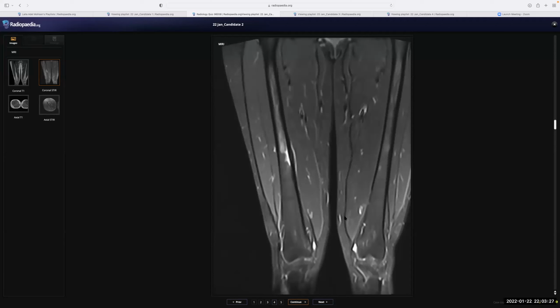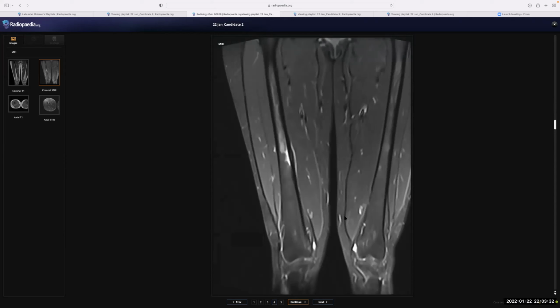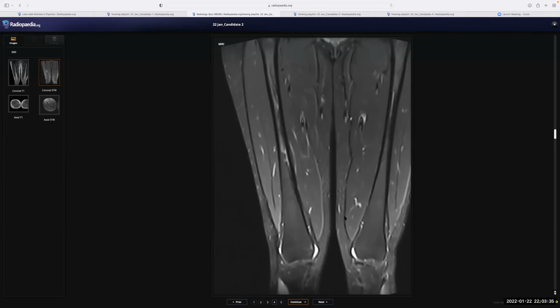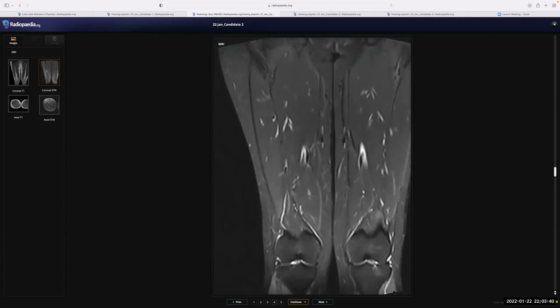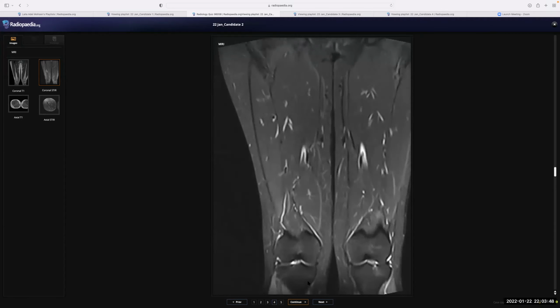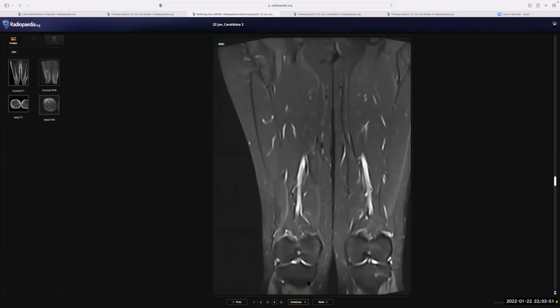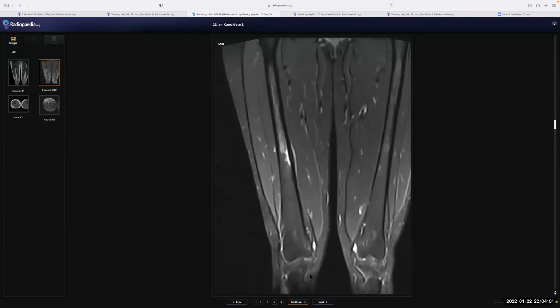So actually, military personnel who undergo rigorous exercise training are more prone to stress fractures. But stress fractures usually should be seen as linear hyperintensities, and perhaps this is the area in the upper tibia on the left, which denotes the stress fracture in this patient. So I believe the patient has a stress fracture of the tibia and not what I was saying on the femur. No, but she's complaining of the right side, not the left. Right side, okay.